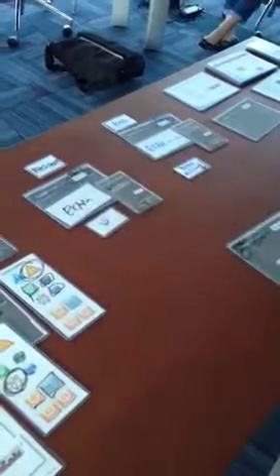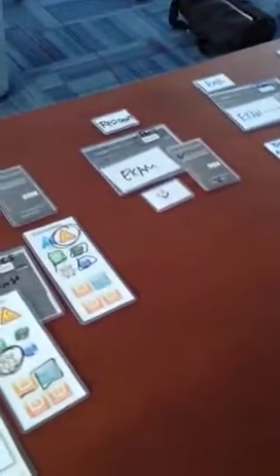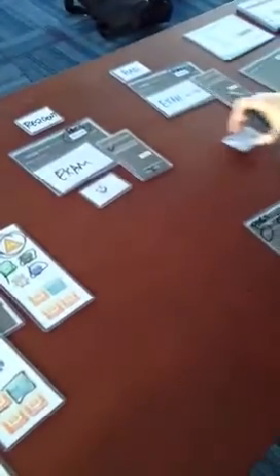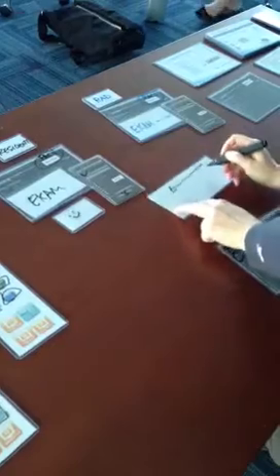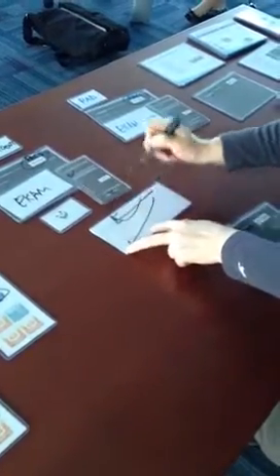They're quite content. They think everything's fine. The next morning, the faculty radiologist comes in, and they say, oh yeah, there's a discrepancy. So they communicate not only to the resident, but also they have to communicate back to the ED so that this process is followed through.